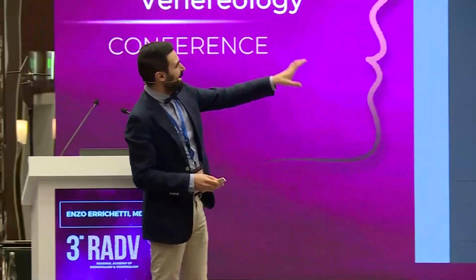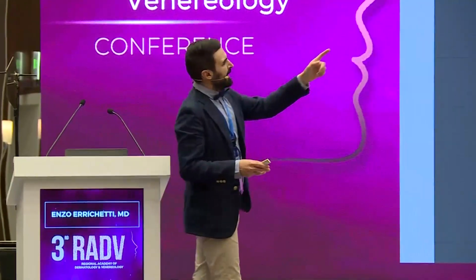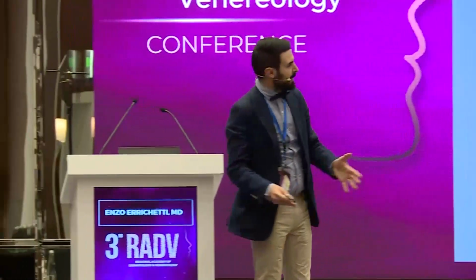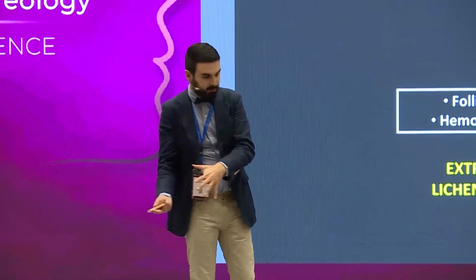Okay, so a flow chart. Sharp edges, it may be vitiligo. In vitiligo, we nearly always have sharp edges. And in post-inflammatory hypopigmentation, we have blurred, ill-defined edges. These three conditions may have ill-defined and well-defined margins, okay?